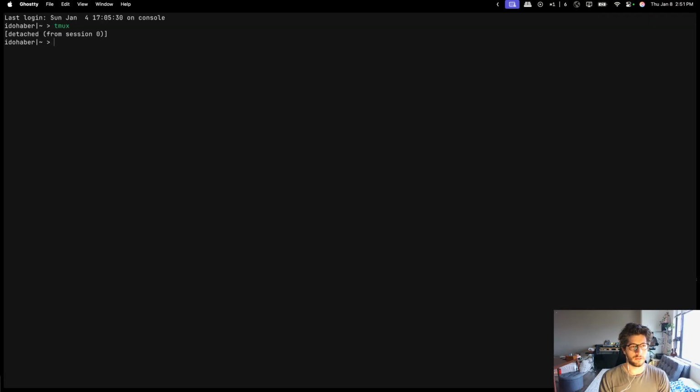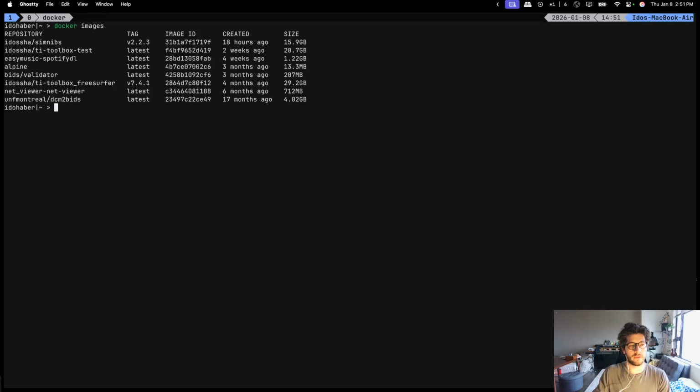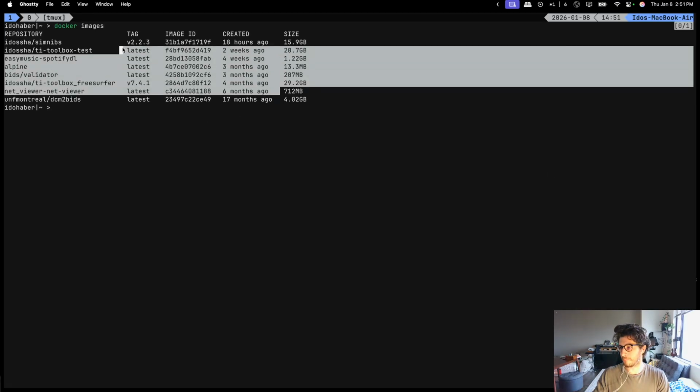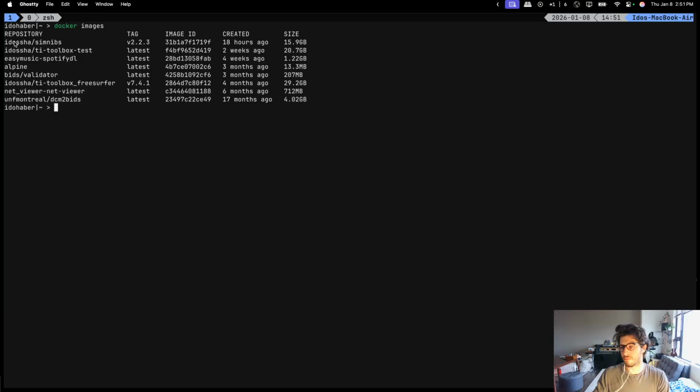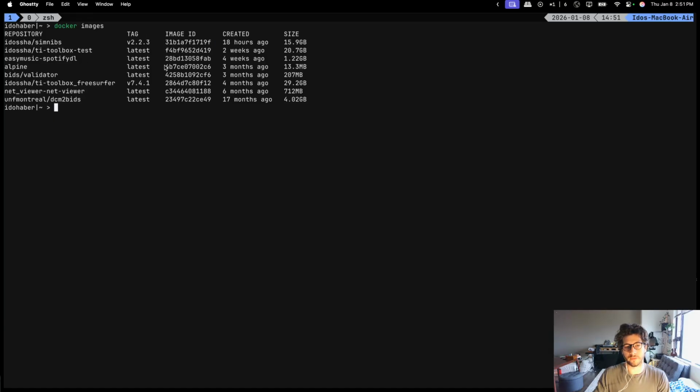Okay, if you have multiple images, then all of them will be here. And I recommend not having more than two to keep your system clean, as these images tend to be quite big.